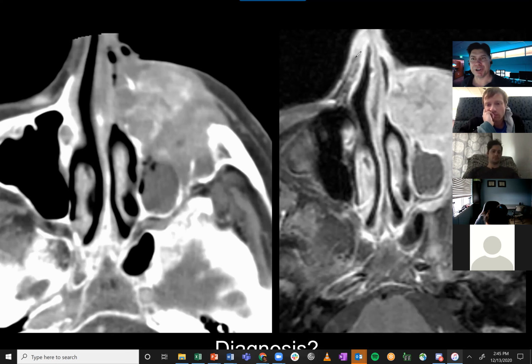Sometimes we differentiate perineural invasion as a pathology thing and perineural tumor spread as an imaging thing. But if you had a tumor at this location, what might you think about in terms of spread with perineural tumor spread? What is the route? What nerves would this get on? You mean for this lesion or in general? For this lesion, yeah, this one. For this one, what nerve?